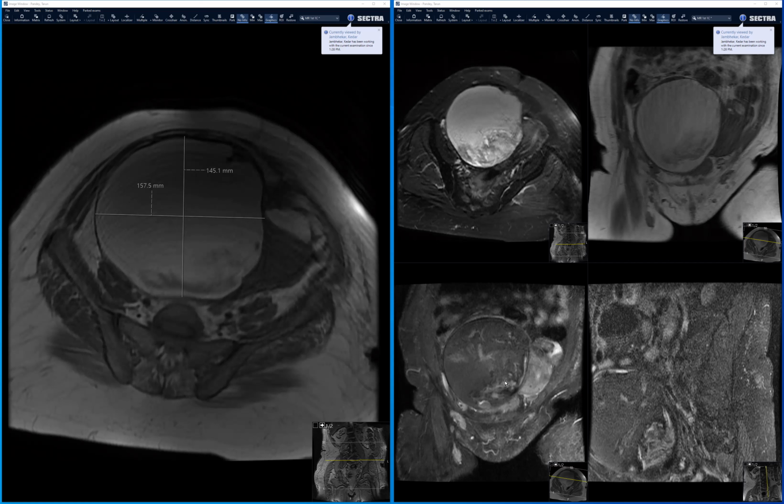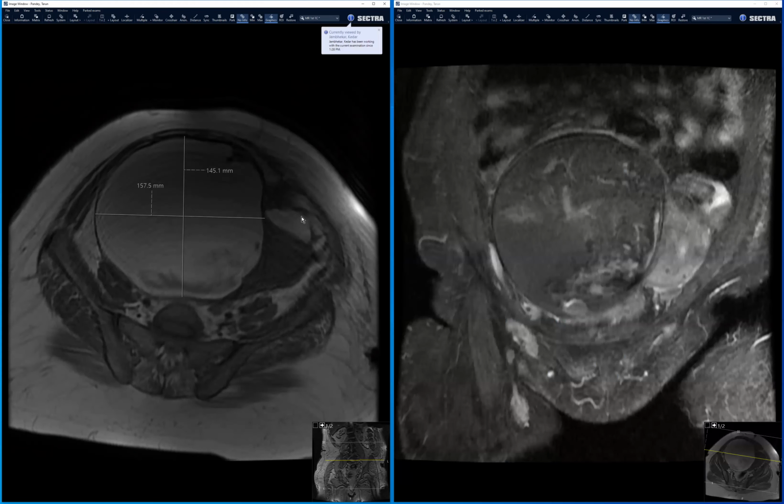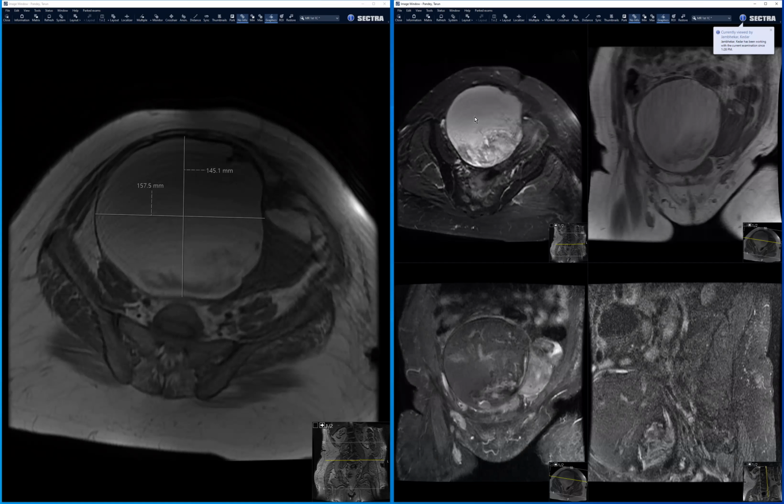what fat would. So the point is, if you just have a STIR and a T1, you would end up calling this fat and a dermoid. But here, having a fat-sat T2 has really helped us, where there's really no suppression. So this is a well-known phenomenon. One of my residents sent me this article from Eurorad, where they have basically said that this is a mimicker of fat.